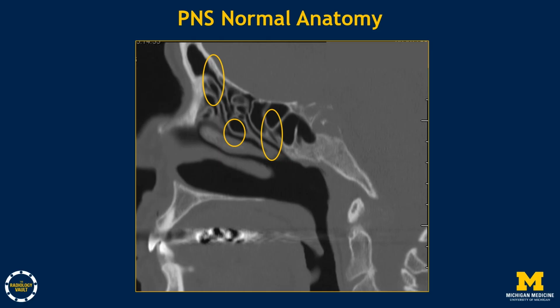The next is the anterior ethmoid air cell and maxillary sinus drainage into the hiatus semilunaris via their inherently narrow ostia. The third narrow area is the sphenoethmoidal recess, which is the final common pathway of drainage of the posterior ethmoid air cells and the sphenoid sinuses.